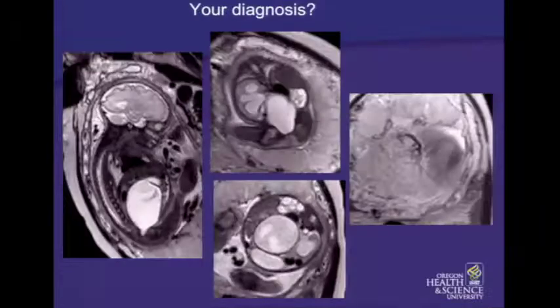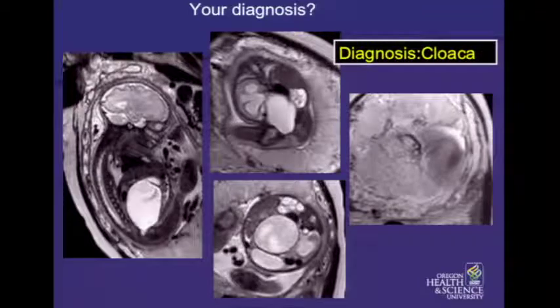She had an MRI, and interestingly, on the MR, we couldn't see the separate fluid-filled bladder, but the morphology of the pelvic structure was very reminiscent of a very dilated vagina, and what we see here is the fundus of the uterus also filled with fluid. Here are the kidney findings and the perineum showing labia, but otherwise no orifice here. So this is a diagnosis of cloaca.